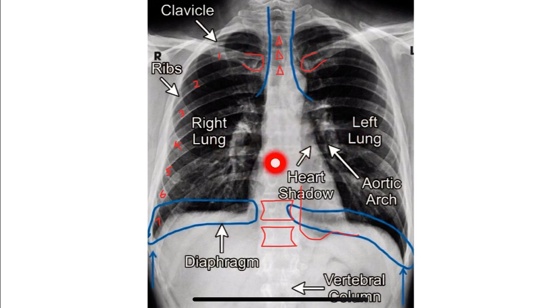Here we are looking for any apparent cardiomegaly using the cardiothoracic ratio, which is the ratio of the width of the heart to the width of the thorax, which is normally less than 50%. If it is greater than 50%, it suggests cardiomegaly or any congenital heart disease.